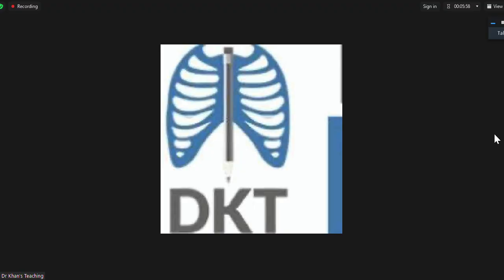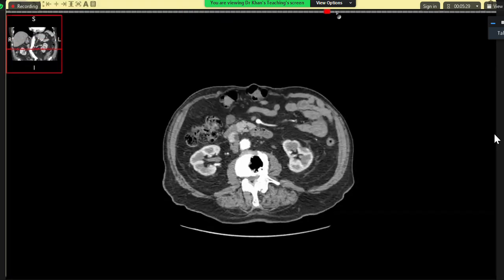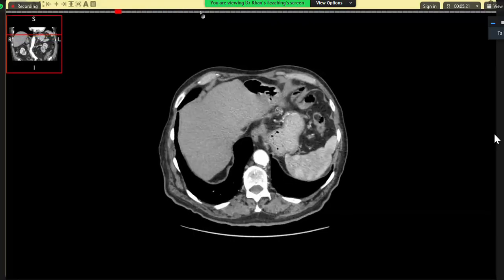So I am going to share it once again. Yeah, here you are. You can see it. Yes, you can ask for the mouse. This is last case of the day. Okay, thank you. Request remote control. Sorry, doctor, I can't scroll. Could you please scroll it to me? No, no, I'm scrolling now. Thank you. Just concentrate on the upper abdomen and forget about everything else.